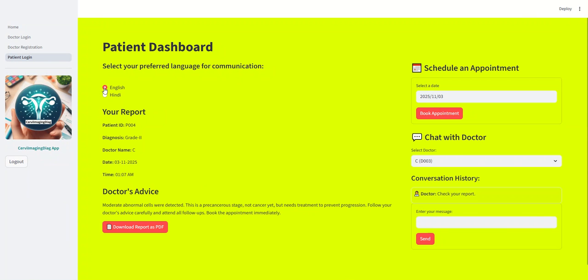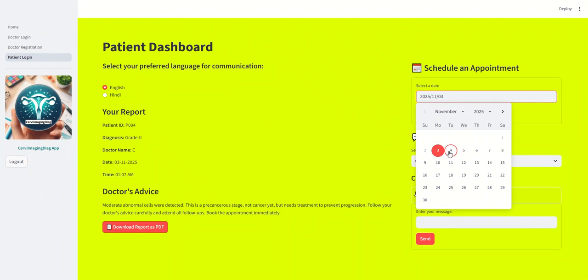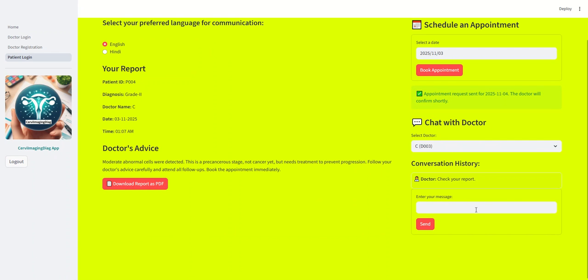But remember that when she clicks on the report generation button, the PDF file will give the overall report in English only. After that, obviously she will go for scheduling the appointment. After the booking request process has finished, she might drop a text like I have booked the appointment, and please let me know your fees. So these are very common processes.